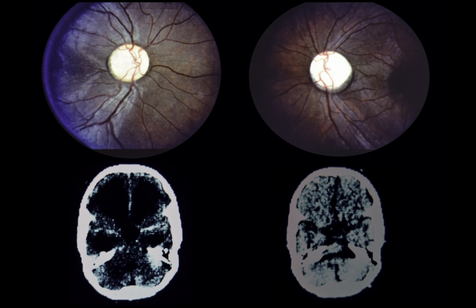Slide 68. Optic atrophy from congenital hydrocephalus. This 1-year-old black male was noted to have rapid head enlargement since birth. His mother observed that he did not follow objects. Both pupils reacted sluggishly to light. Upper left and upper right. Both optic discs are diffusely pale with retinal nerve fiber layer loss. The retinal vessels are normal.